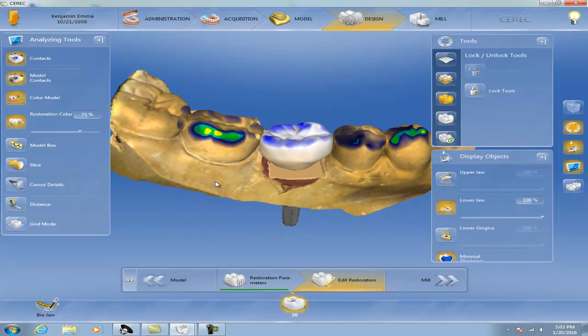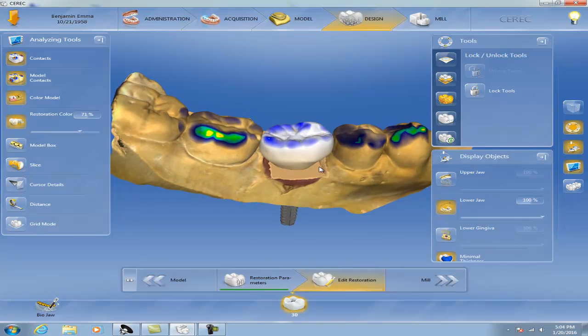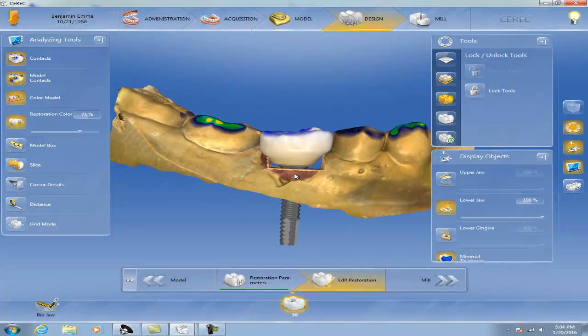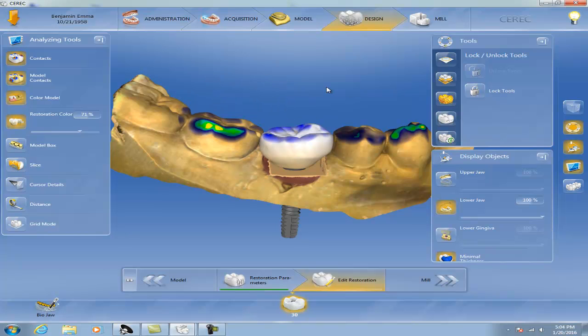Nothing major, but many people are asking, including me, where's the split tool, where am I going to find it? You're going to find it in your tools on your right side, but not on your wheel. Okay, so that's a major difference again between 4.3 and 4.4 software.